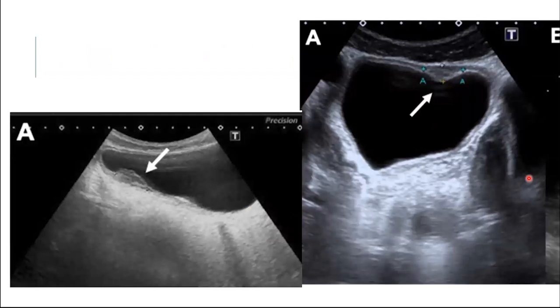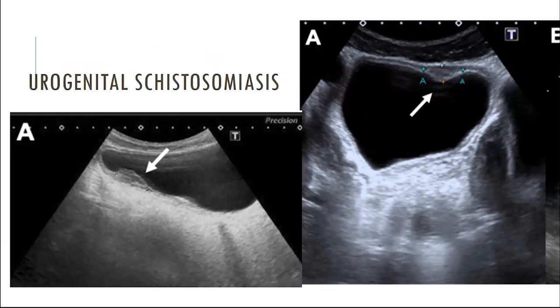This is for the gold star of the class. Thoughts on this one? Anyone work overseas? So in places that have burdens with schistosomiasis, children and teenagers are at high risk for cancer that can revolve around urogenital schistosomiasis. So these are lesions from schistosomiasis that are occurring.